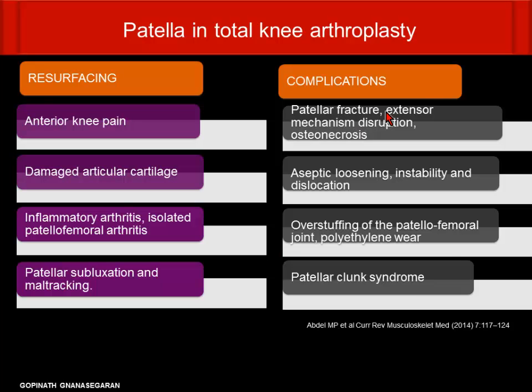So whether you do it or not depends again on individual departments. But most of the problems after total knee replacement will be patellofemoral arthritis. That's what we need to think. Whenever you look at a bone scan SPECT CT of the knee joint for infection and loosening, most of the time that will be normal, but look for the patellofemoral junction. If there is increased uptake, the cause of the pain is patellofemoral arthritis.